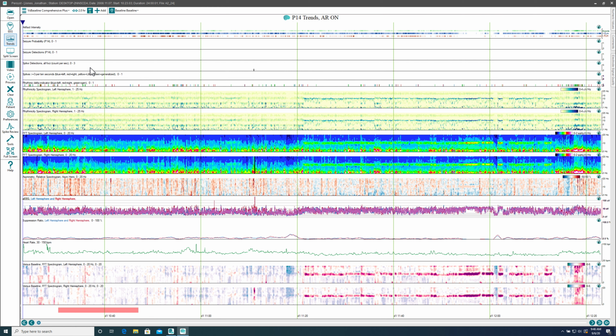We'll get to some more interesting aspects of spike detection later, but one important feature for both the spike and seizure detectors is that you aren't going to get hundreds of false positives, making it more time-consuming than it's worth to review the events. The next line has to do with spike rates, and I'll get to that in more depth in some other records.